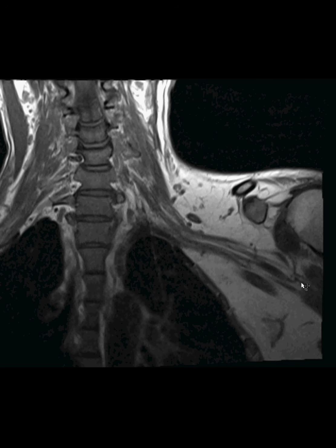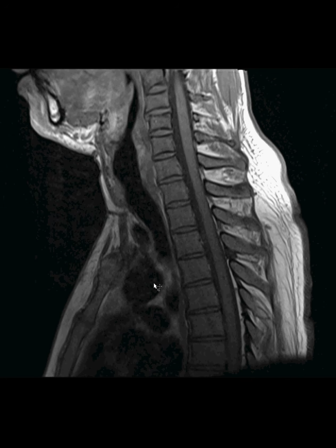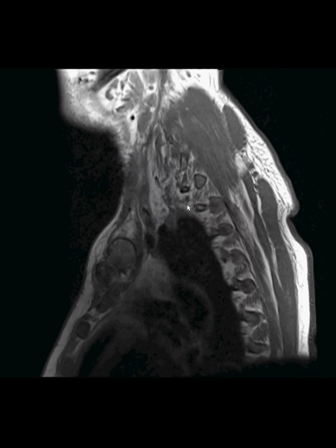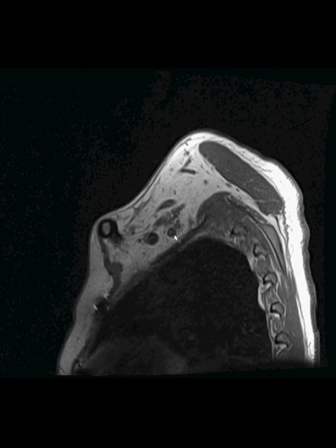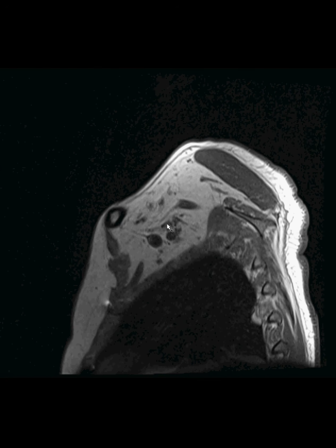On sagittal images, we see it really well, actually. So here we're at the cervical spine. We come out, it's hard to see the exiting nerve roots very well on the T1, but as we get further along, you can see here's the subclavian artery, and these little dots around it represent the nerves of the brachial plexus, and here's the subclavian vein. So really we're looking at these structures.